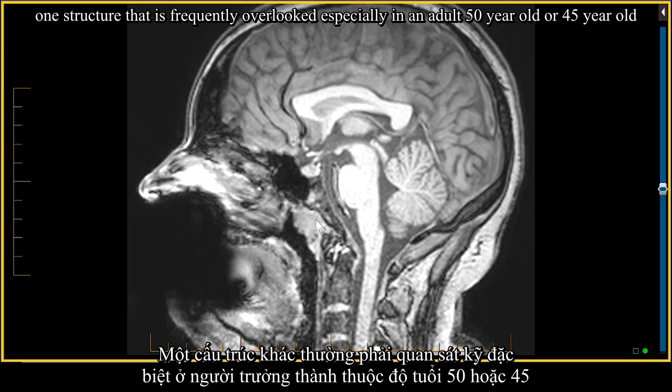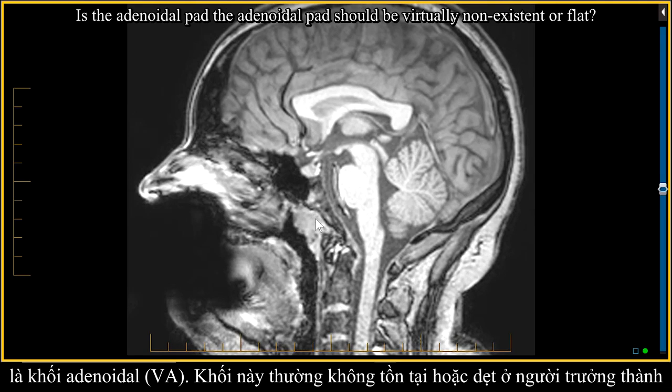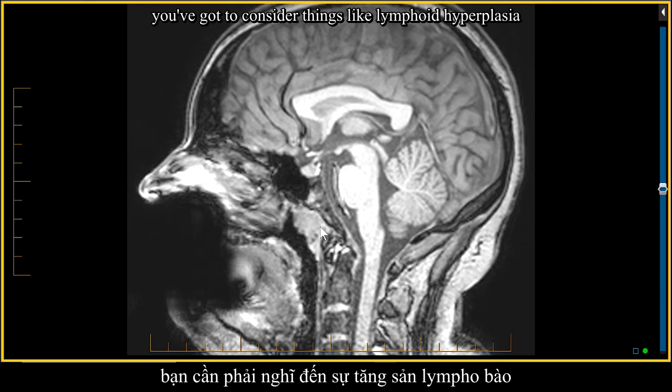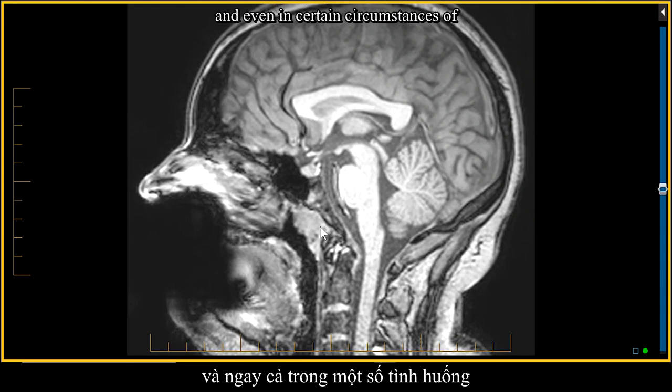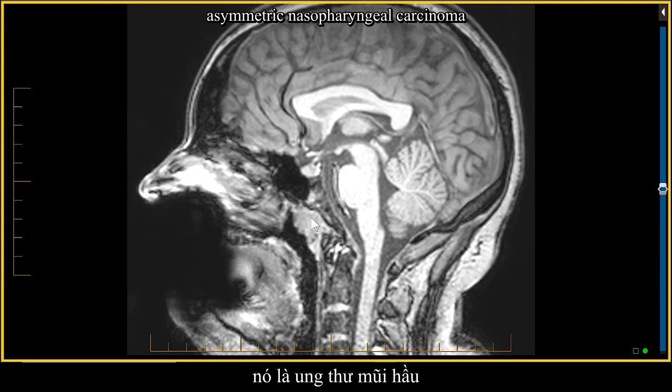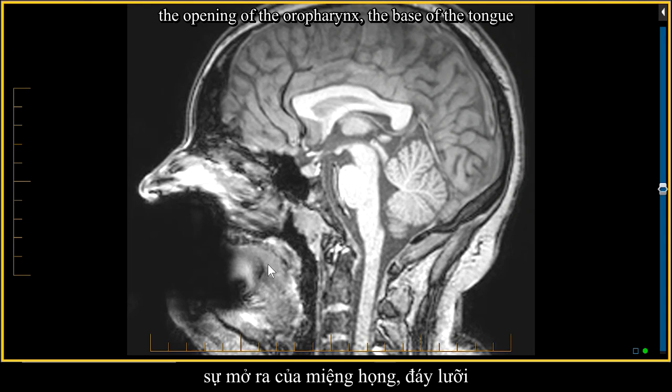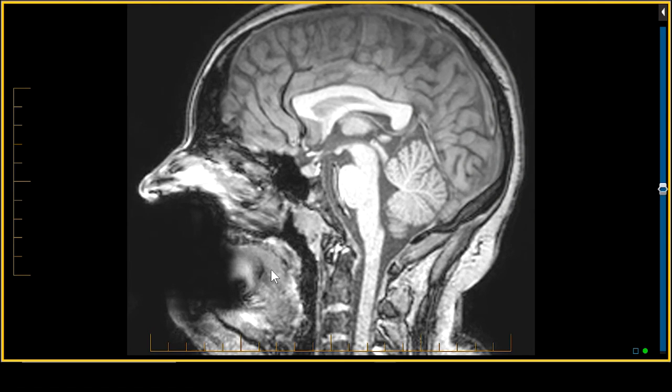One structure that is frequently overlooked, especially in an adult, 50-year-old or 45-year-old, is the adenoidal pad. The adenoidal pad should be virtually non-existent or flat. So when it's hypertrophied, you've got to consider things like lymphoid hyperplasia and even, in certain circumstances, if asymmetric, nasopharyngeal carcinoma. Don't forget to look at the uvula, the opening of the oropharynx, the base of the tongue.